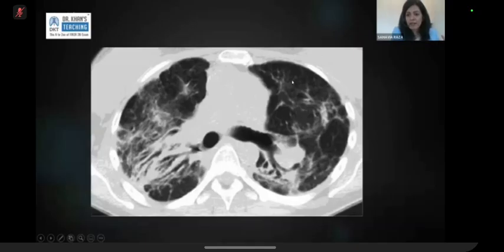Can it be PMF? Yes. Sarcoidosis does not cause PMF. No. So PMF is progressive massive fibrosis. For those of you who don't know, this is commonly seen in occupational lung disease. So the posterior pulling is not specific to PMF. PMF can happen anywhere. So wherever that massive fibrosis or mass-like fibrosis is, it's going to pull towards it. So that PMF can also be in the lower lobe. It can be all over. It's predominantly upper to mid zone, but it's not specific to posterior architectural distortion.